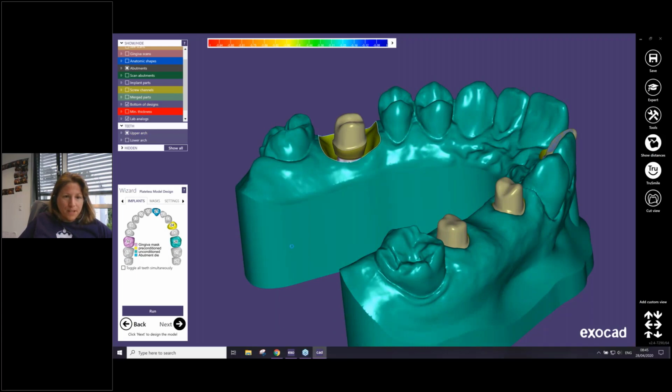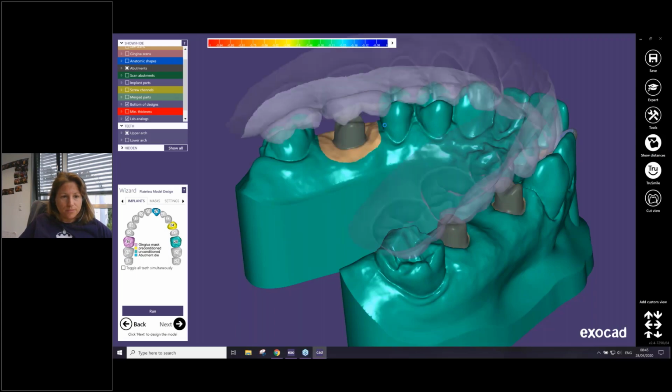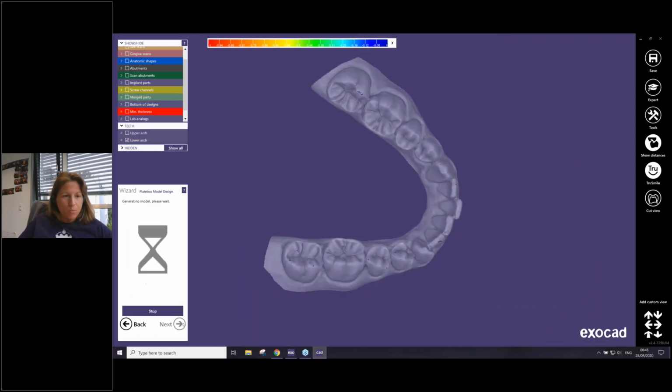Okay, then let's continue. Here it's the same with the values, but we don't have to select some fitting parameters, and the gap parameter is a complete model.